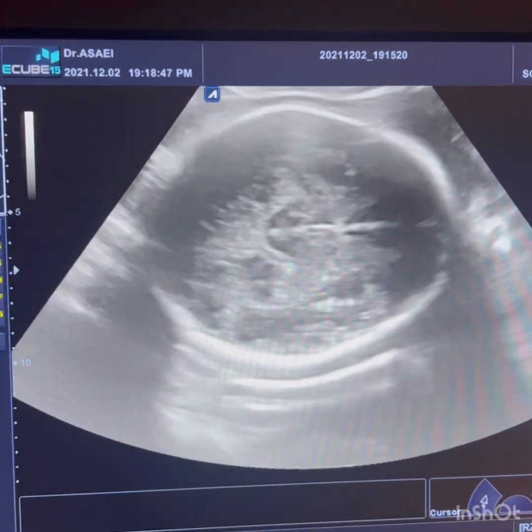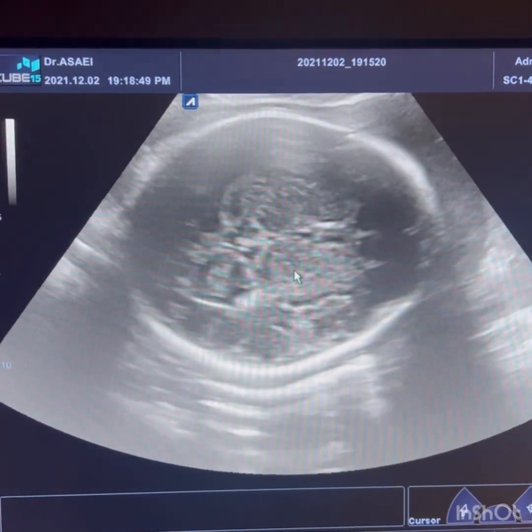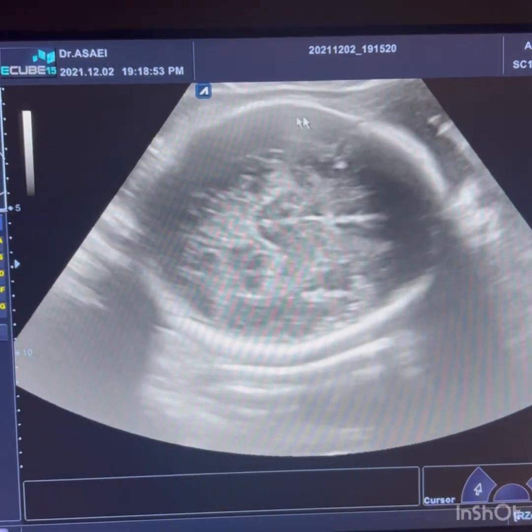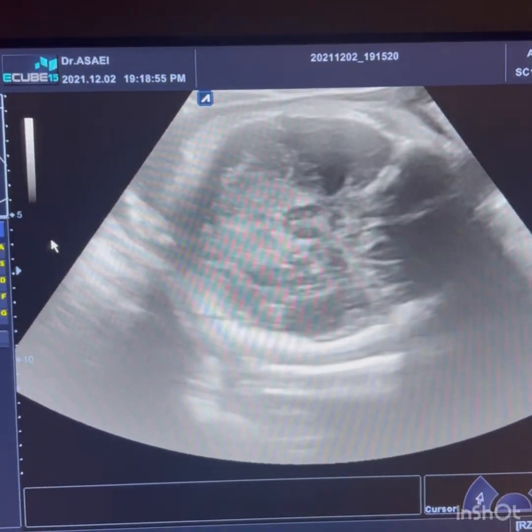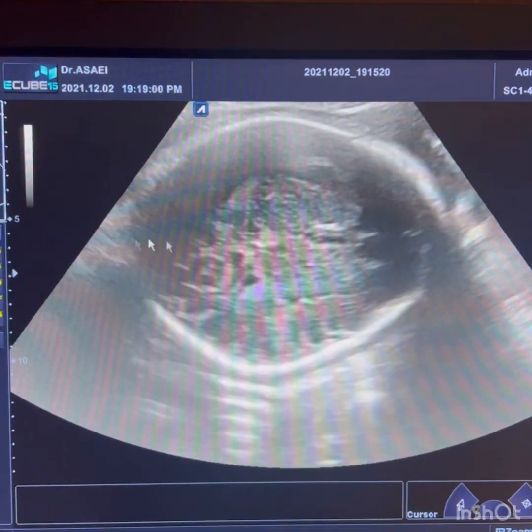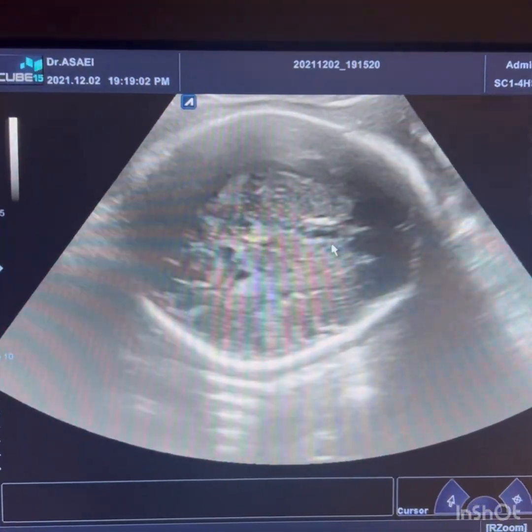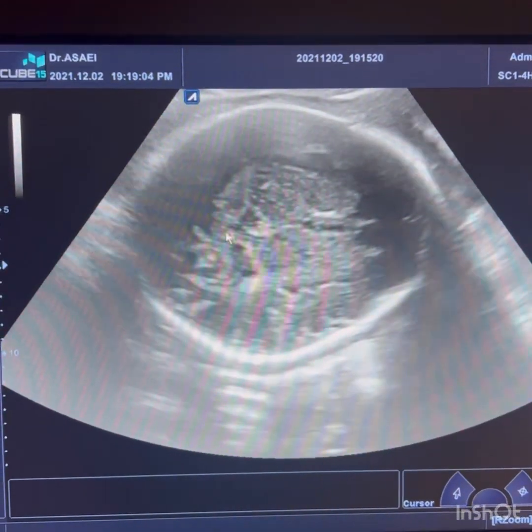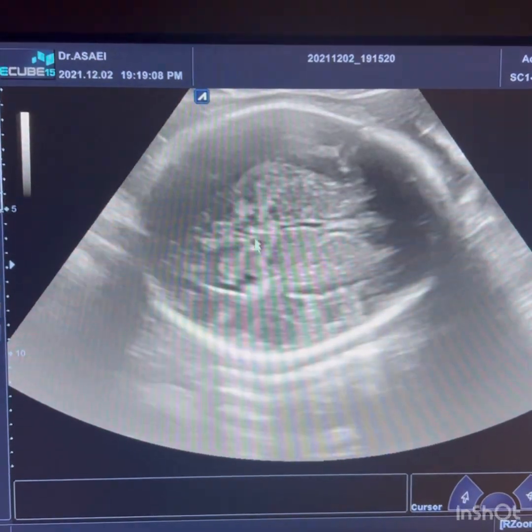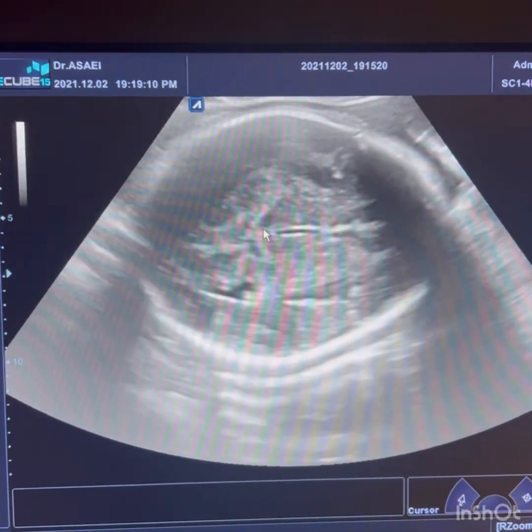And our last fetus is a fetus with brachycephaly. We can see obviously that the head is more round than normal. Expert sonologists do not need to calculate, and they grossly diagnose dolichocephaly and brachycephaly.